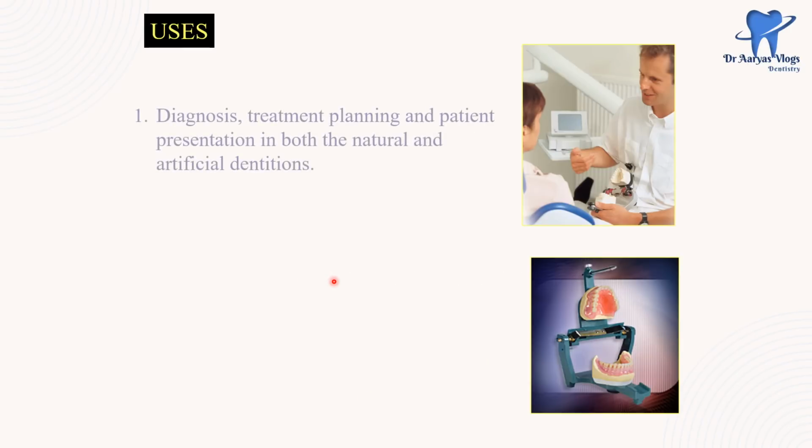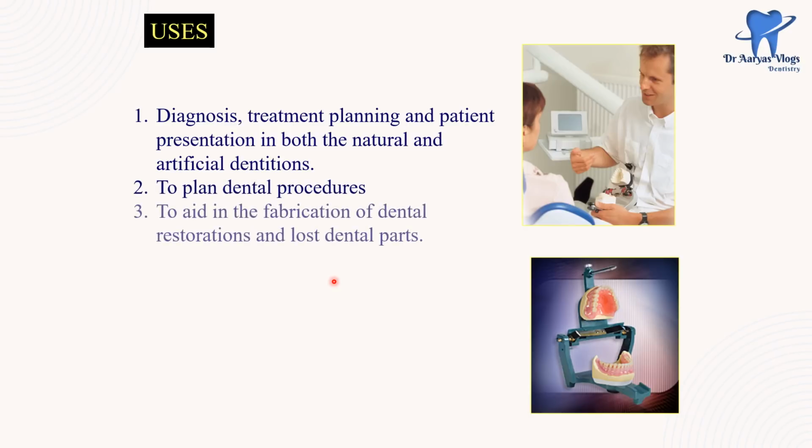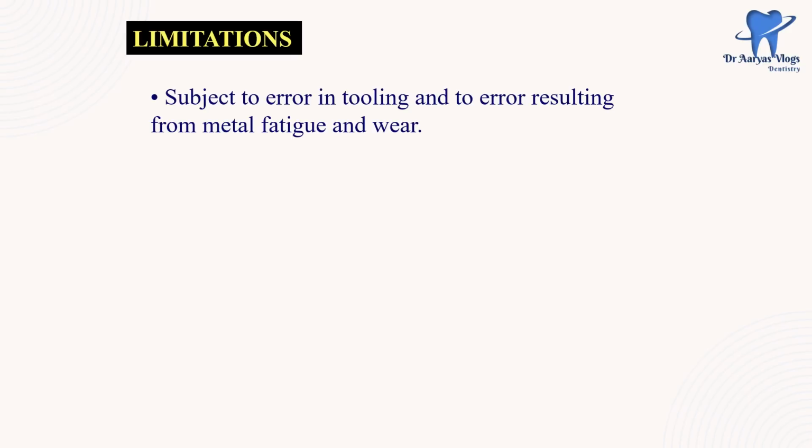And the uses are for diagnosis, treatment planning, and patient presentation in both artificial and natural dentitions, to plan various dental procedures, to aid in the fabrication of dental restorations and lost dental parts, to correct and modify completed restorations, teaching and studying of occlusion and mandibular movements.